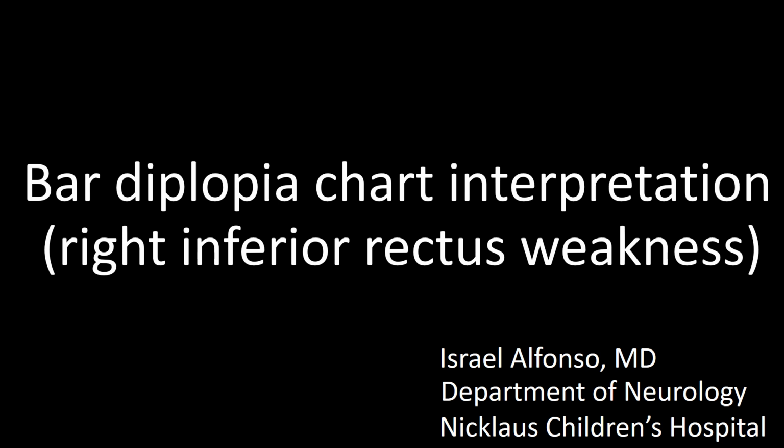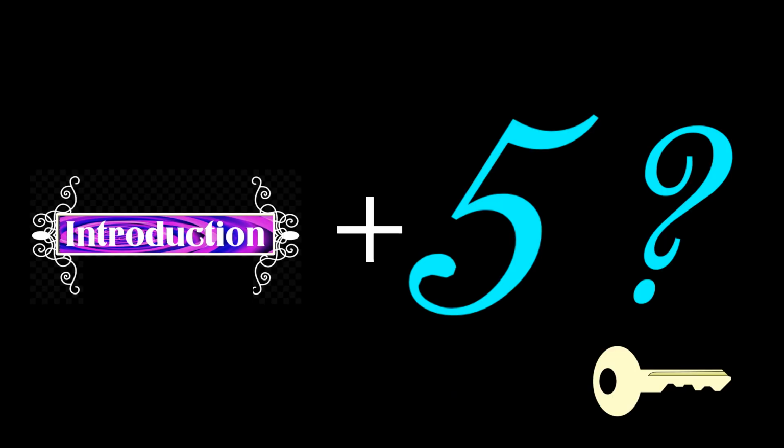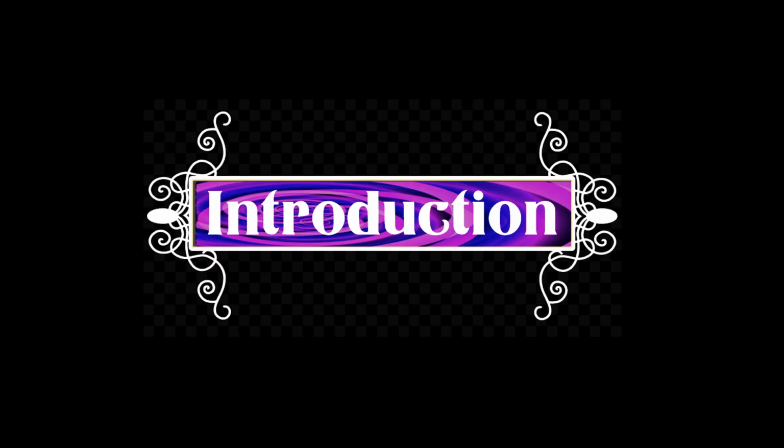This talk is about Barr diplopia chart interpretation. We will specifically be talking about Barr diplopia chart interpretation in a patient with right inferior rectus weakness. This talk consists of a brief introduction and the answer to 5 key questions. The purpose of the introduction is to create a figure that will help us answer the 5 key questions.